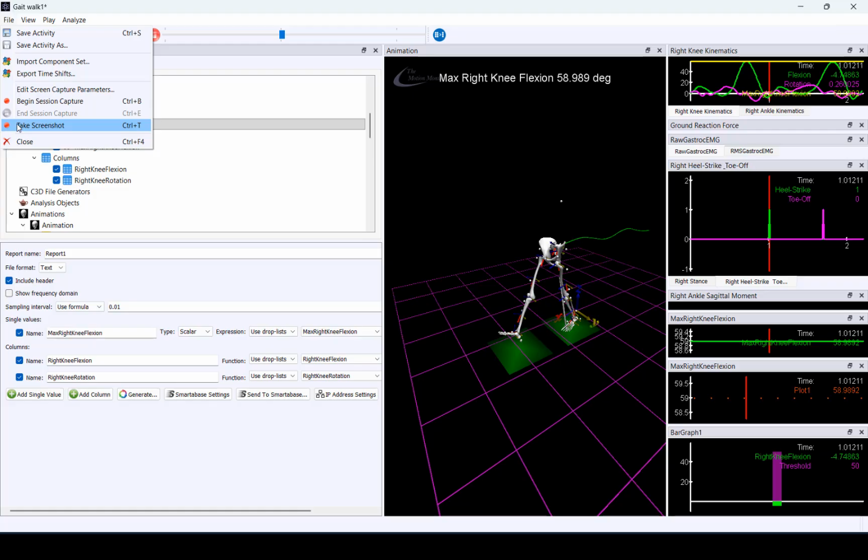For those who are more advanced users, you may also wish to write scripts that automatically take screen snips at specified time events, apply analyses, and generate reports. This is all possible within the software using our built-in functions. For those who might not have the time to figure these out, we also have some predefined analyses for certain sports, functional movements, and we would be happy to provide a service and to discuss options for custom workspace and analysis.